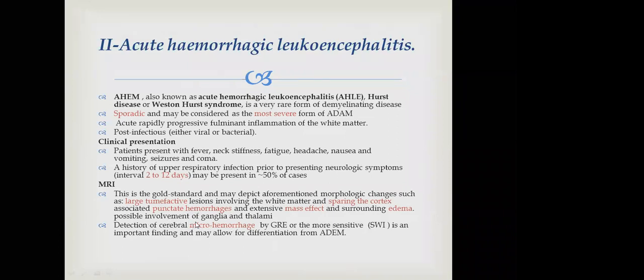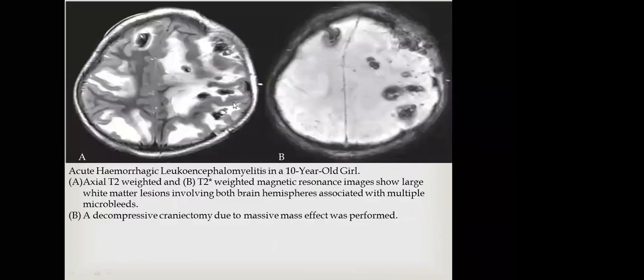Detection of microhemorrhage on gradient and susceptibility weighted images is an important finding and allows the differentiation from ADEM. This is a case of acute hemorrhagic leukoencephalitis in a 10 year old.